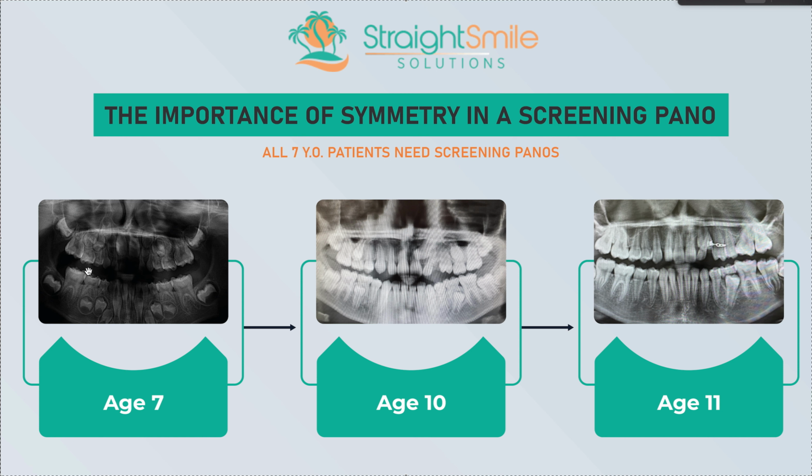So you can see, hopefully on this side, I'm going to use ortho terms, but this is the 5, the 4, the 3, okay? The premolar, the canine. That's nice. I mean, it's a little constricted here, but at least that's vertical, right? And you can see they're all not quite enough space like you do on the bottom, but it's decent.